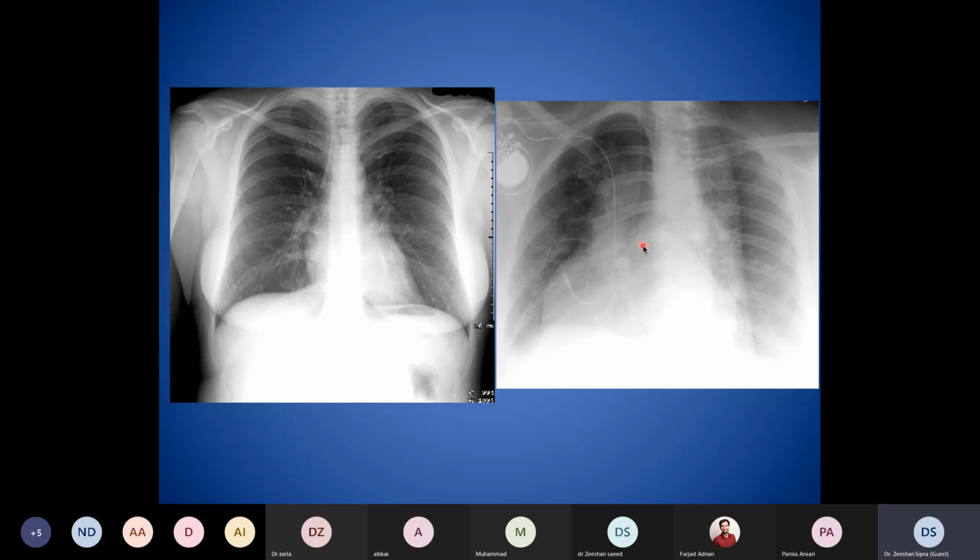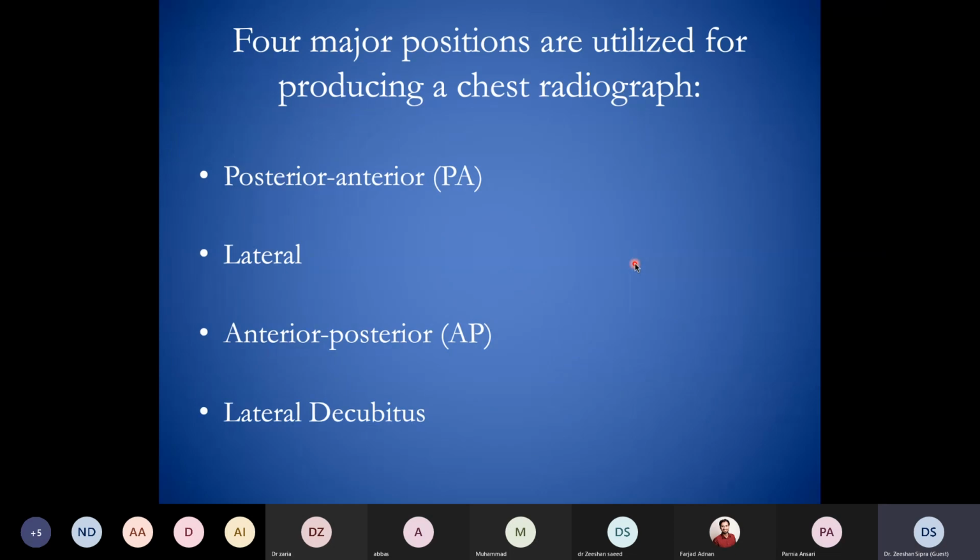For rotation, a single rule is that we can comment on the lungs, but this center of the image, which includes the heart, the great vessels, and the mediastinum, we actually cannot reliably comment on. And similarly on the mediastinal shift as well. So I hope so.